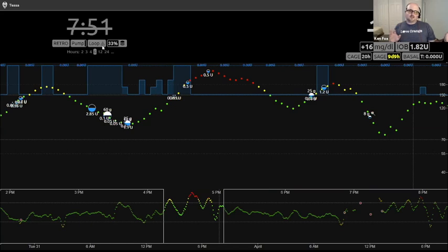The Nightscout site's not going to load all that prediction information back that far just because it's a lot of information to load. So you really can only look at 24 hours of loop information. You can look at your CGM data and the carb entries and all that. But once you get back more than 24 hours, things like this insulin on board pill and the carbs on board, if you're showing it, don't become useful because they don't actually update with the loop information. They update with Nightscout's own internal way of computing how much insulin you have on board, which is not really what's happening. So just know this information is not useful.